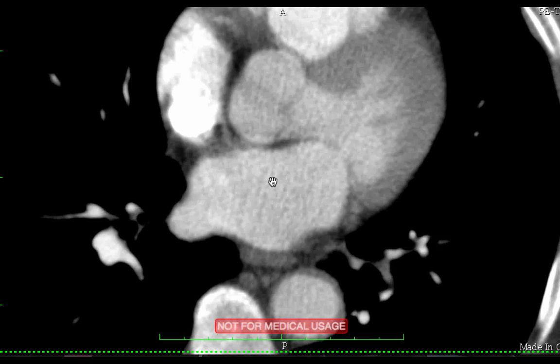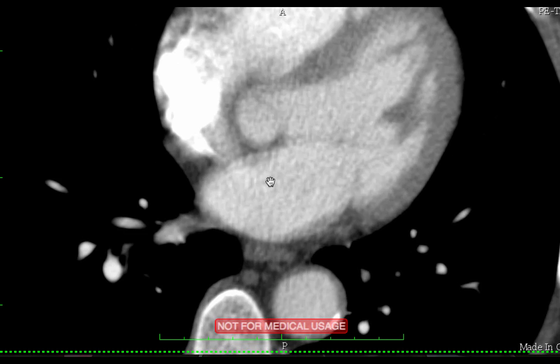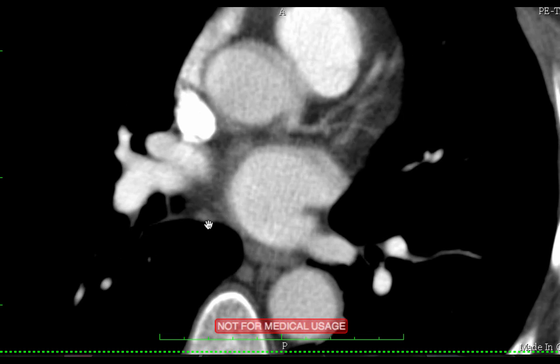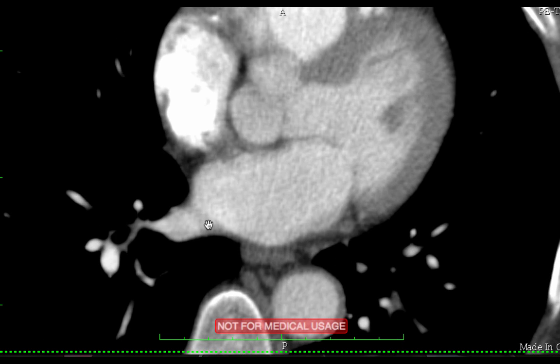The left atrium. Good, the left atrium. And the left atrium has pretty much two venous paths that go into each side. So you have two prominent venous entry points on the right and two on the left for pulmonary venous return to come back into the left side of the heart.